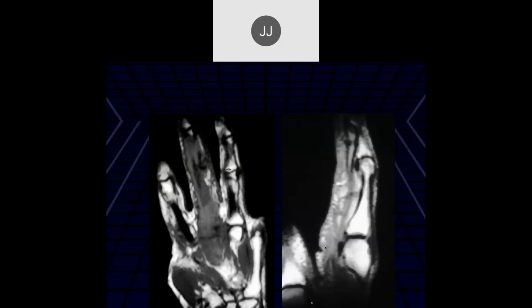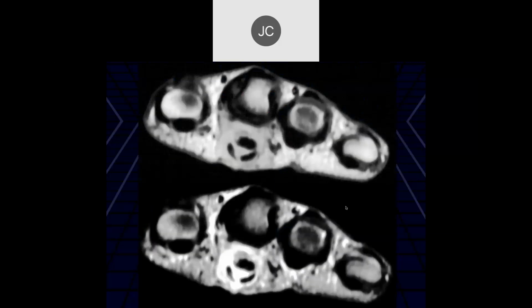So in the region of the flexor tendon, I'm not seeing normal tendon fibers. There's soft tissue thickening. Could be synovitis and tenosynovitis. Right. Yeah, exactly. This is flexor tenosynovitis. This was a patient that we'll talk more about next week who had psoriatic arthritis, and this was a sausage digit from psoriatic arthritis.